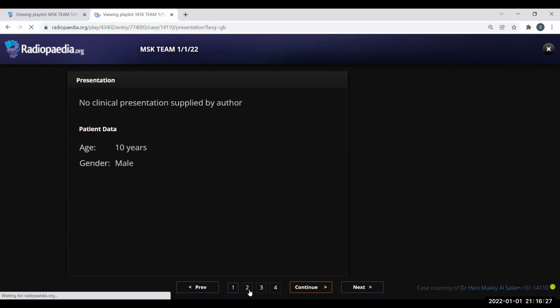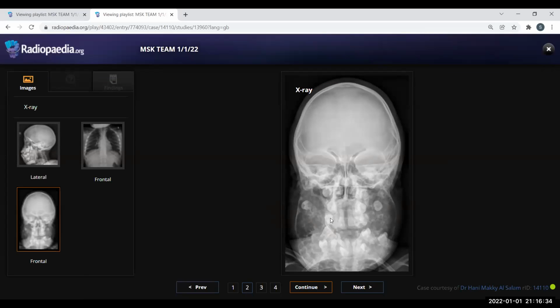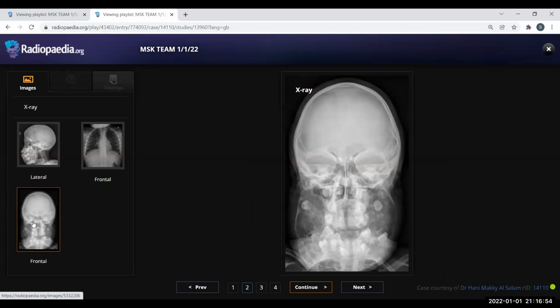The next case, as you said, this is cherubism. What I wanted from you is, when given a case, just describe it as much as you can. Use the word expansile, use the words cortical thinning, use the phrase innumerable tiny lucent lesions with well-defined margins and narrow zone of transition noted in the mandibles. I do not see any associated soft tissue. I do not see any cortical break. I do not see any periosteal reaction. All you see is cortical thinning, right? So this is, as you correctly said, cherubism.